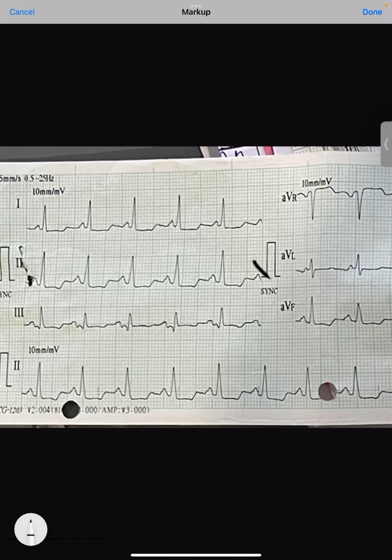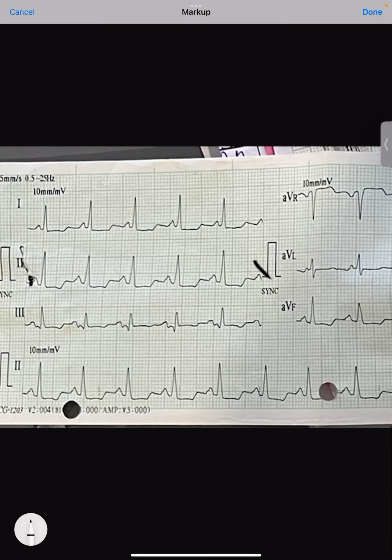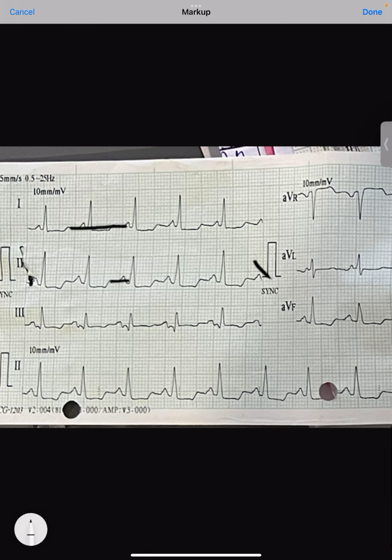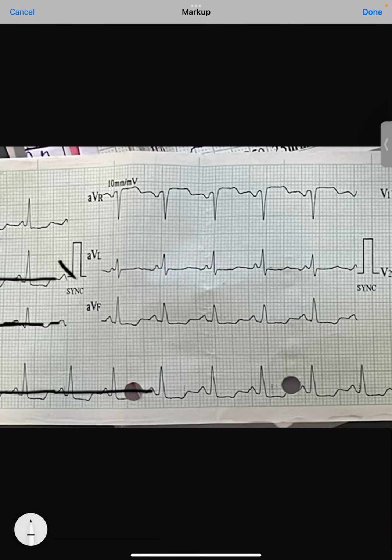So we always have to see the ST elevation and ST depression, and to say ST elevation or depression, we should define the baseline. This is the running baseline. We can trace the same line all the way. The P wave where it starts, this is the baseline.